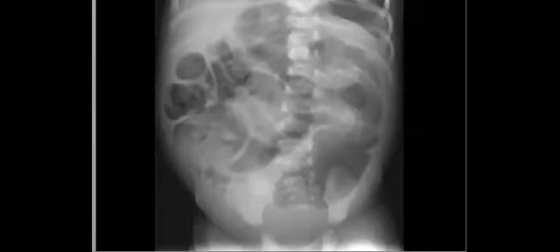So what is now your differential diagnosis? Meconium ileus, perfect. Ileal atresia. And we mentioned total Hirschsprung. And finally, meconium plug or small left colon syndrome, right? So these are probably your four differentials, and you can add any atresia, anal or colonic.